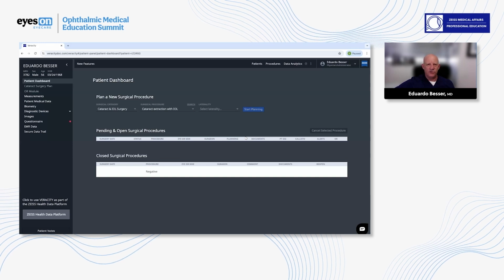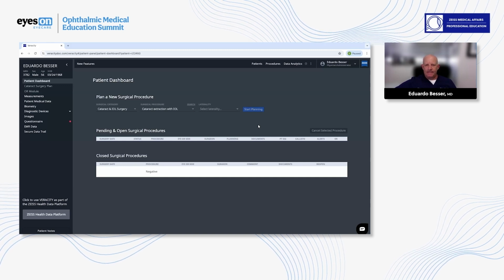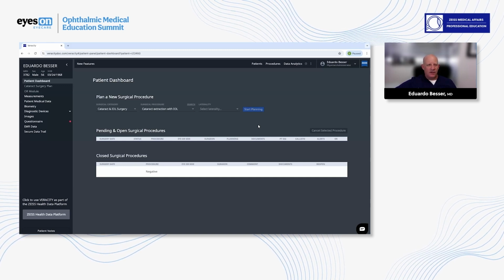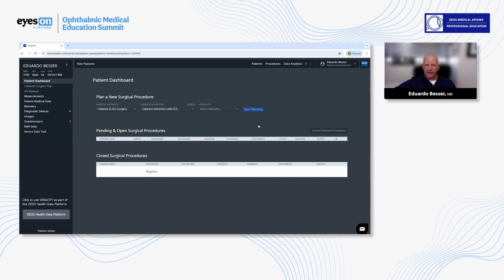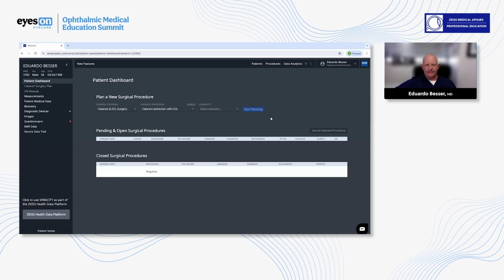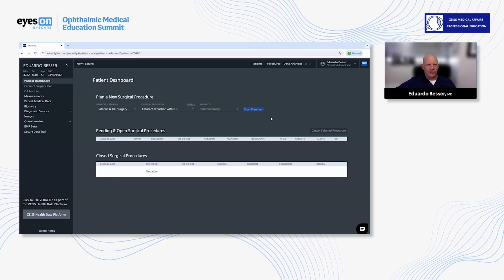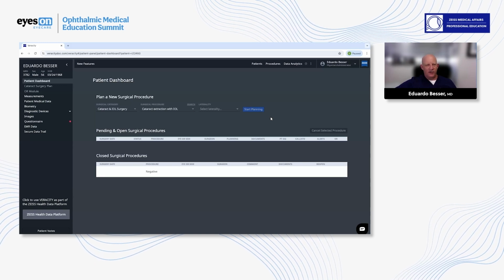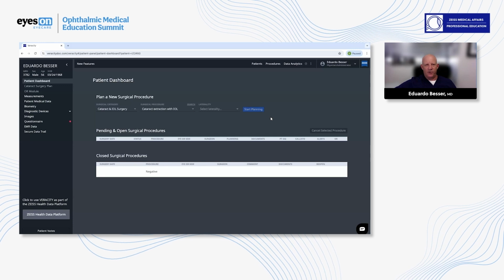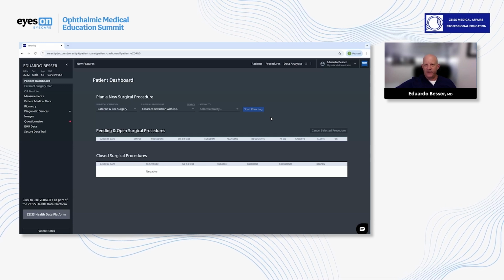And I wanted to introduce you to the dashboard, and I wanted to introduce you to surgical planning using the Veracity. It really is just a very efficient way of doing your surgical planning all in one place, rather than having to flip through multiple pieces of paper and having to transcribe data from one site to another. And so everything is just done centrally. And it also kind of takes your tech out of the question rather than having to ask them to run all these different calculations.